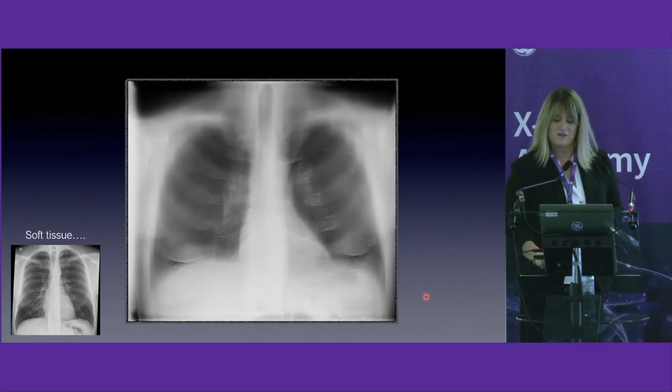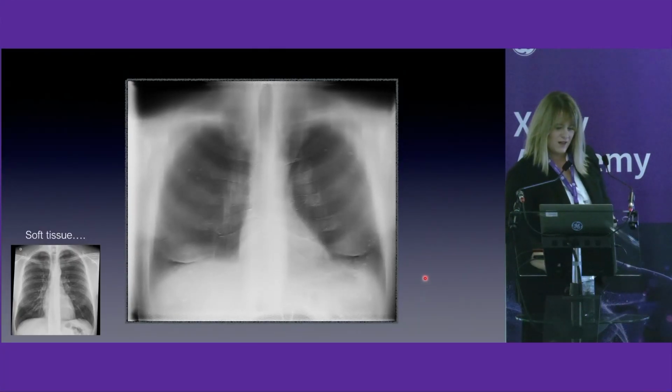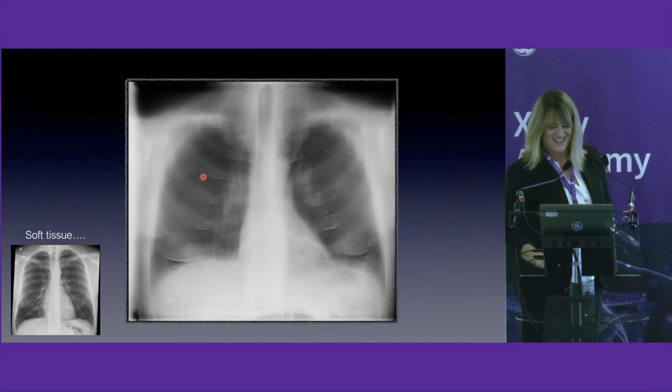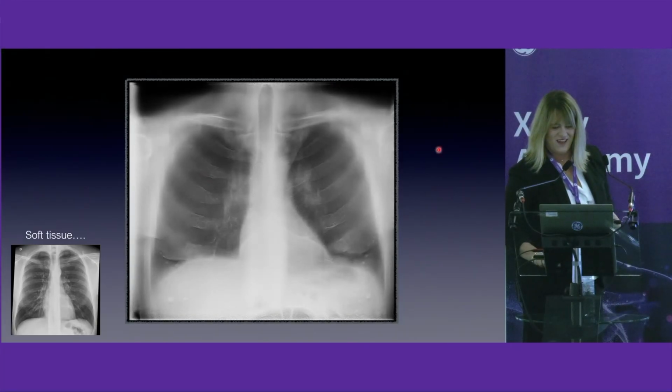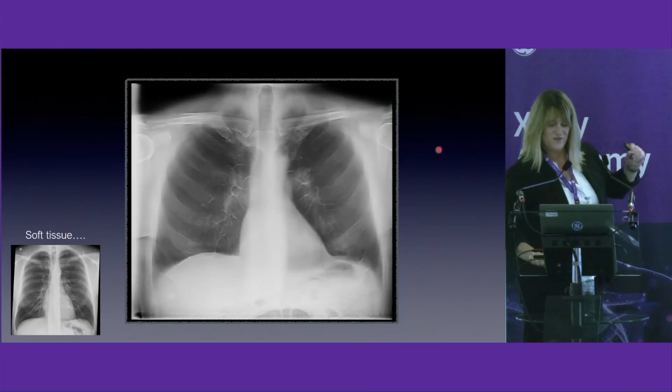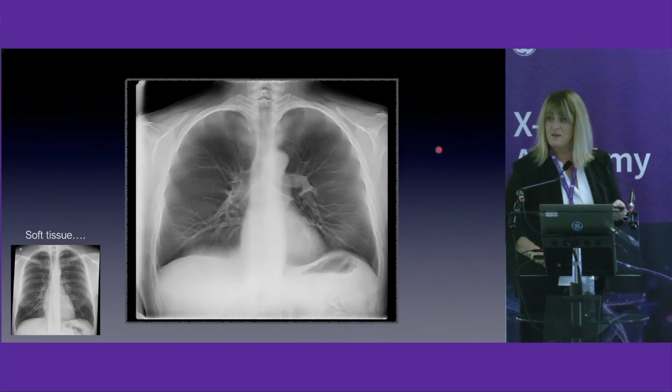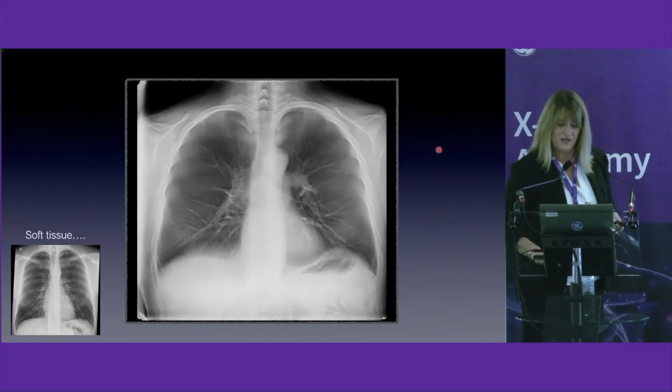what happens during tomosynthesis. So this one is the very anterior image of our thorax. So this is skin, and going into the posterior part of our chest. This one is a normal chest DTS, as we can see in the PACS system on our screen.